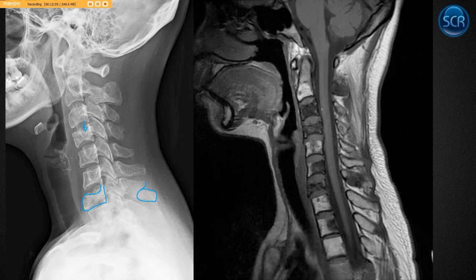And then we look at the comparison MRI. This is a T1 weighted image. Marrow should be fatty. So all these dark arrows, all these dark areas are neoplastic areas of involvement. We can see this is the area of spinous process involvement, which has precipitated this path fracture. And then you can see the other areas. So the quite extensive disease burden in this person for an X-ray that at first glance looks relatively subtle.